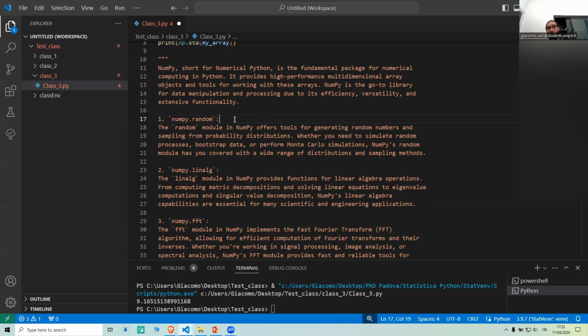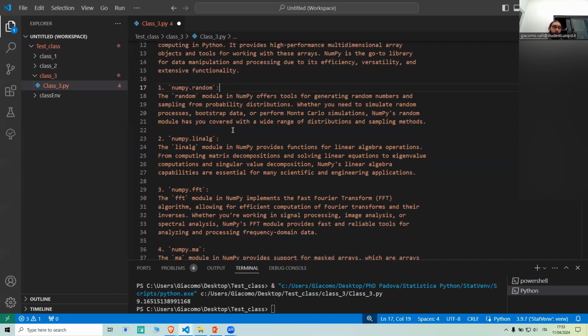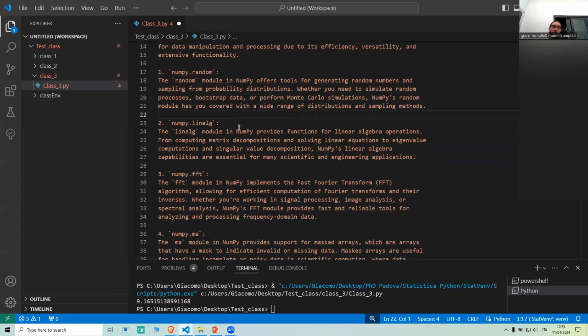You can use this module whenever you need some random things, for example, Monte Carlo simulations, that are sometimes used also in electromyography. But if we want to go closer to EMG signal processing, you may want to add some random noise to a signal that you simulate, or you want to see how some algorithms are performing if there is noise.